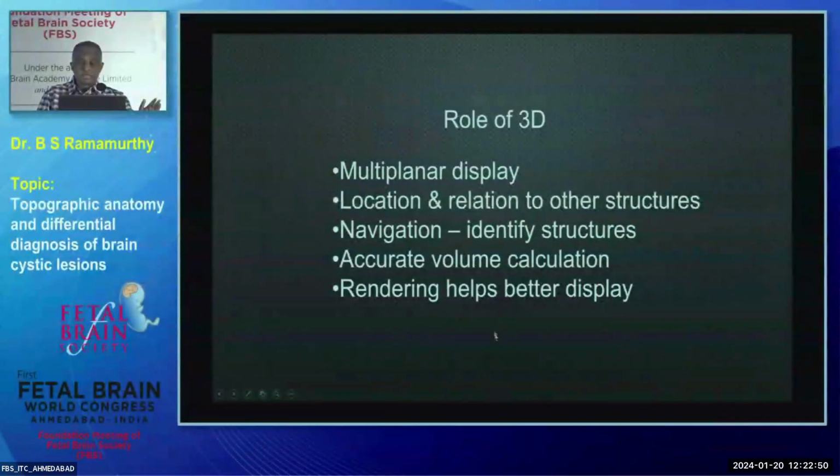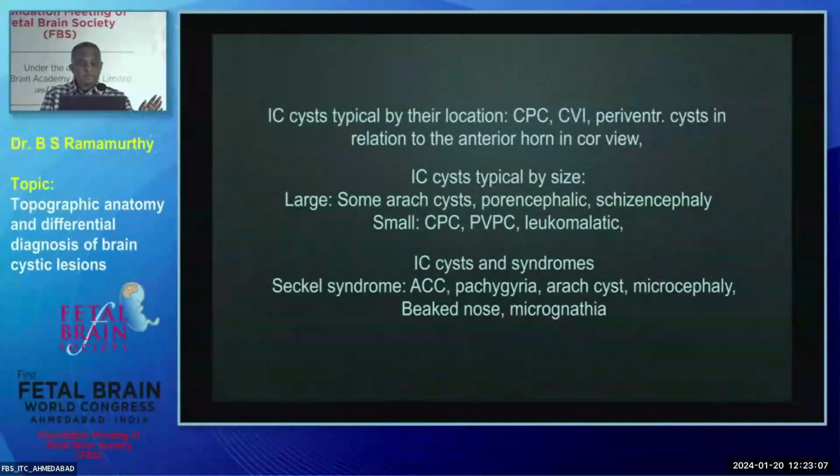And of course, you have to look at the relationship to the other structures. You can navigate in a volume and easily get at the landmarks that you have around the cyst, accurate volume calculation, and sometimes rendering helps you display better, right?